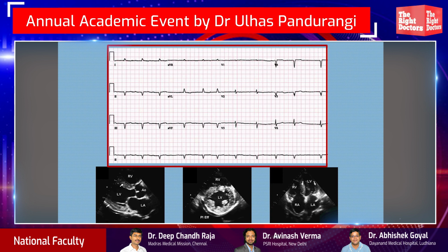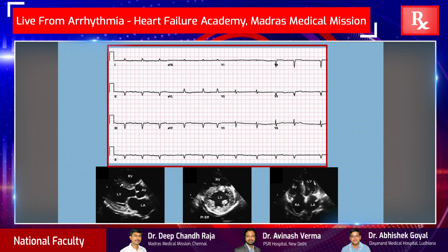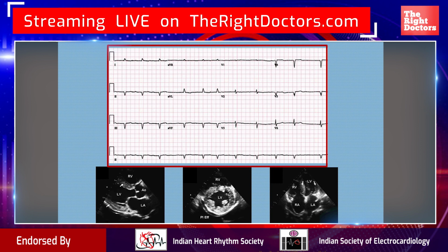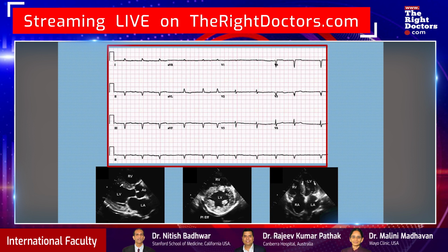You can see how the amyloid has infiltrated the myocardium, what we call the speckled appearance, classically in an echocardiogram. So the amyloid infiltration of the left ventricular myocardial wall. The thickness looks preserved in the left ventricular myocardium. However, they are not the muscle tissue. They are all being replaced with the amyloid tissue. Hence, you have these low voltage complexes.